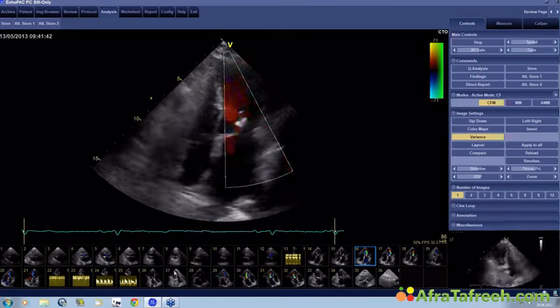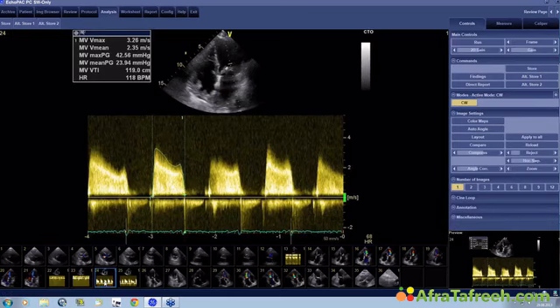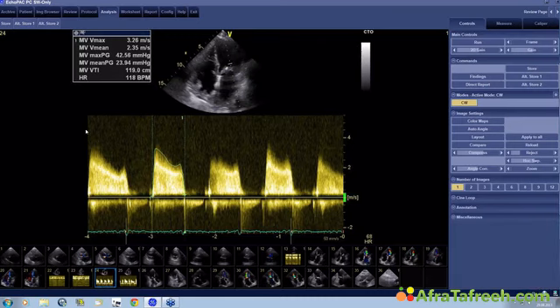The next thing we have to take a look at is what the gradients are. And remember, the patient is symptomatic, and this would make us believe that stenosis should be severe, especially if we think that mitral stenosis is really her problem. To calculate the gradients, obviously you just trace the Doppler spectrum across the mitral valve, and then you get a gradient, in this case, of 23 or 24 millimeters mercury, a mean gradient, and a maximum velocity of 3.3 almost.